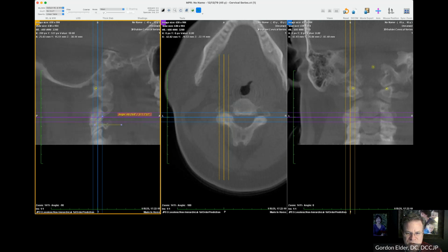And now I'm measuring C3 because if C2 is misaligned, typically, conventionally, we talk about C2 being misaligned to the segment below, C3. So C3 is our reference point, and we're going to adjust C2 to C3. So that's why I measured the C3 side of the joint. Does it make that big of a difference? Not in this case. In some cases it will, but let's just try to be as accurate as possible. There's going to be enough inaccuracies in the whole system as it is.